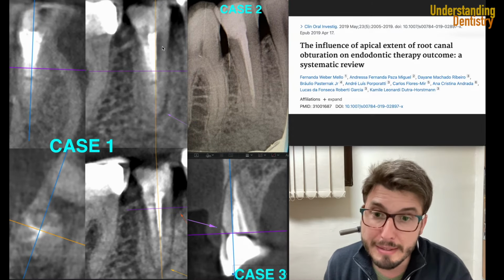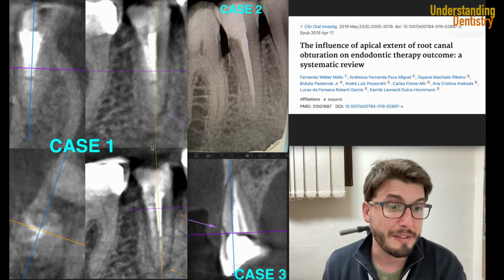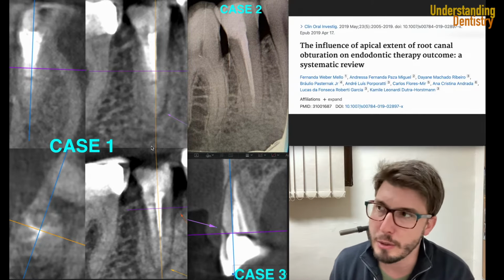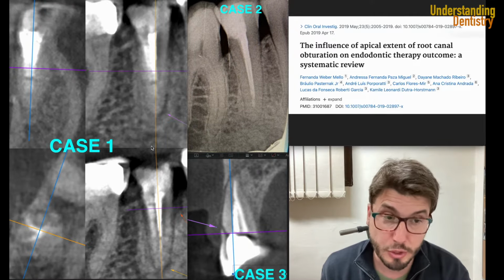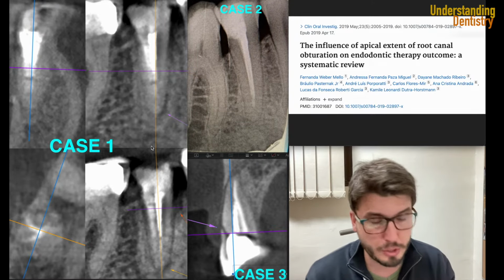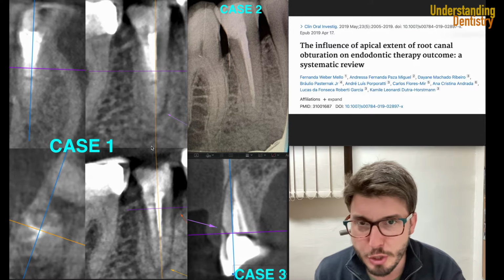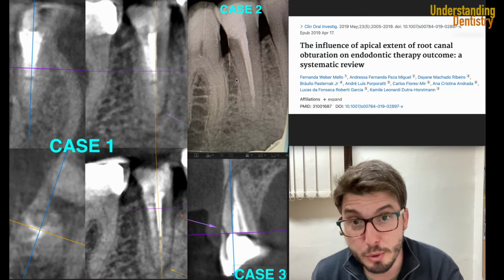You can follow up, but you need to always correlate this with the clinical situation. So do we have tenderness to percussion? If yes, then we suspect fractures even more. But this is a CBCT, and if the CBCT has a good resolution, you would be able to diagnose most of the fractures. Sometimes the CBCT won't detect the fracture; that's also described in the literature. So it depends on the cases, but at least nowadays with modern CBCT devices, fractures and even cracks are detectable by CBCT.